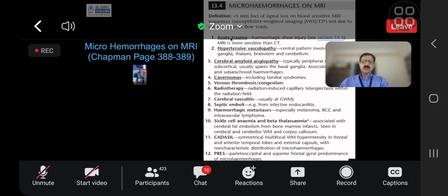And other than all of these things, diffuse axonal injury, you see this thing, number 1 on the list. Acute shearing injury, acute trauma, this must be high up on your list.